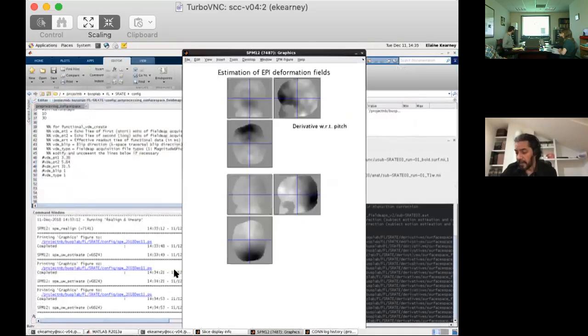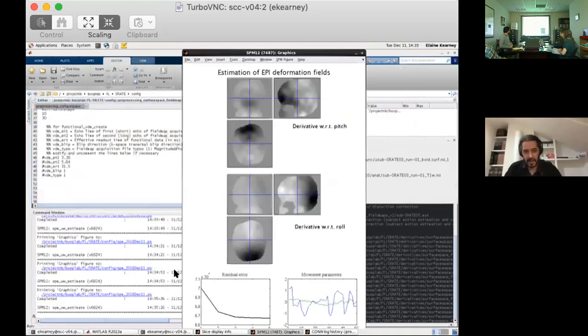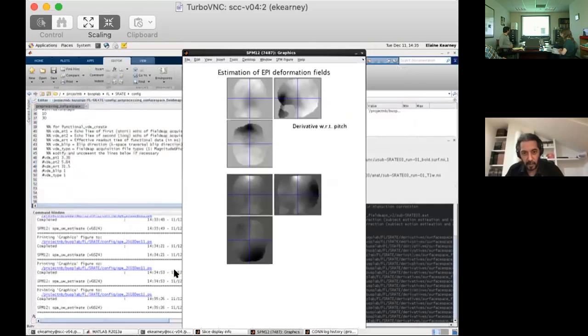Yeah, I read somewhere that J minus translates into what is called Y minus in FSL convention. So I should probably be able to figure out how the XYZ plus minus convention translates into the SPM convention. The FSL to SPM translation probably has more documentation, so there is still hope that we might be able to figure that out.